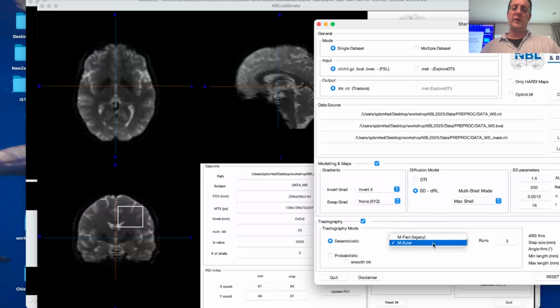By default, now we all stick to Euler. It just gives a much smoother result. It is the algorithm I explained before. At each step, we put the cone, we interpolate it.